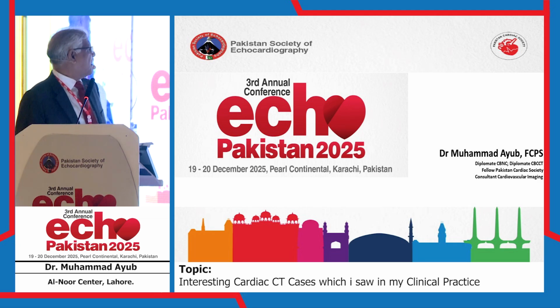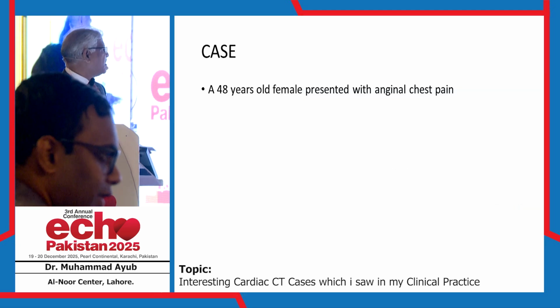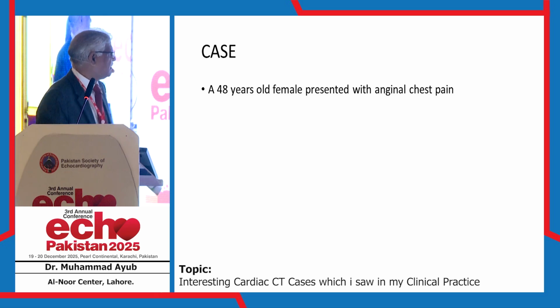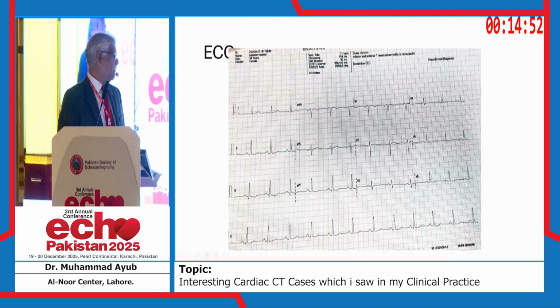Bismillahirrahmanirrahim. My first case is a 48-year-old female who presented with anginal chest pain. And this was the ECG, which is almost unremarkable. But the consultant still felt that the patient is having typical angina symptoms and should undergo conventional angiography. Personally, I might not have recommended this, but the consultant opted for a conventional angiogram.